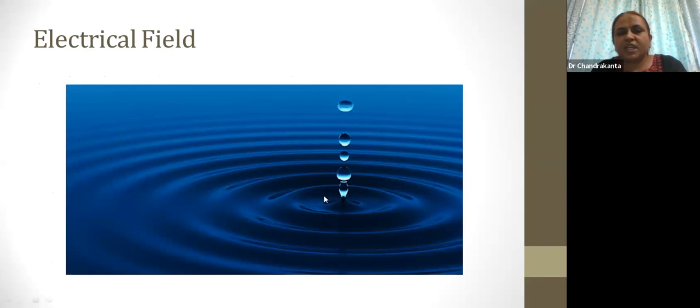So the abnormality doesn't restrict to a particular area, it has a field. So the area surrounding that particular electrode will also show abnormality. If only a single electrode is showing abnormality, it's most likely an artifact, not a true epileptiform discharge.